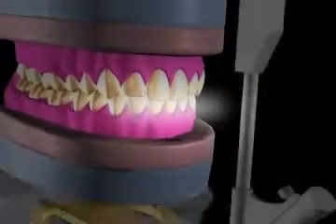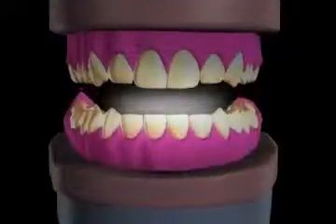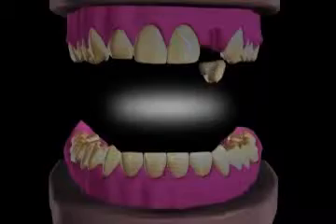In contemporary dentistry, there is a better understanding of the jaw joint. This has led to a revised view. The articulator is no longer considered the standard, but rather a resource or tool. You now see how the technician manufactures a total prosthesis with the assistance of the articulator.